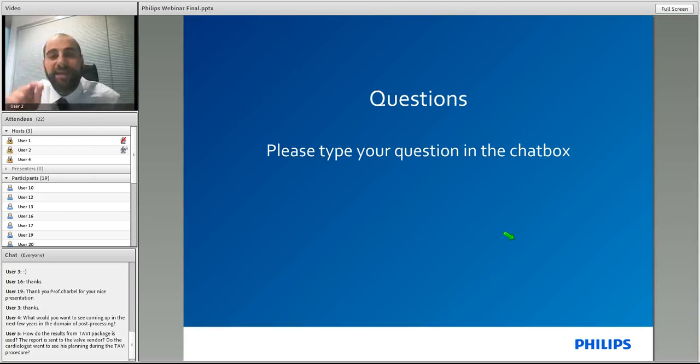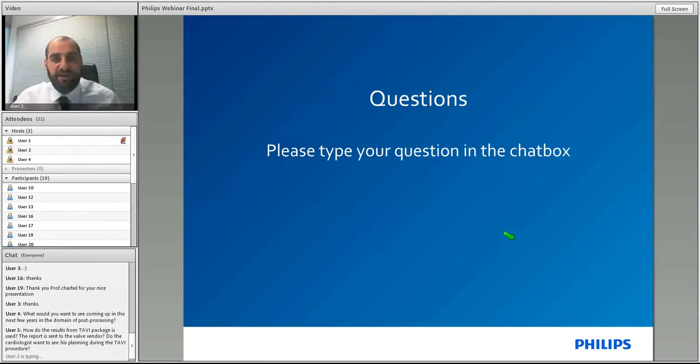I can bookmark exactly what I want the cardiologist to see, and he can actually log in anywhere he wants, and you'll have that login for him. I can send him this link, and I can send it to him via email. This is the beauty. Once I have done it, I send it to him via email. He can go in and click. He opens it right up after he gets a security alert, because there's multiple security levels, so we need to be sure that we protect this data of the patient. And he can actually see exactly what we have done.